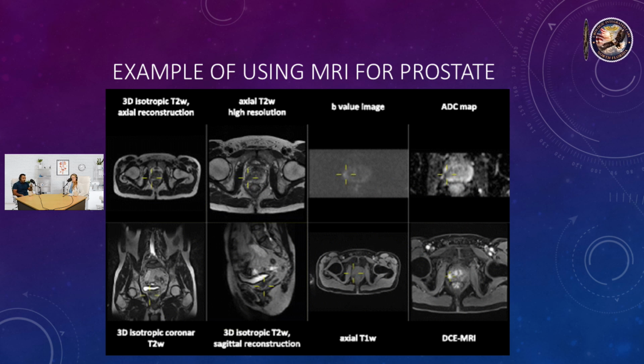You'll see qualitative images that are great, and you'll hopefully get to the point where you're quickly popping these images up, and you can say, okay, I think there's tumor here, there's tumor here. Look at diffusion and T2. Where is it localized to? How is it adjacent to the surrounding structures?